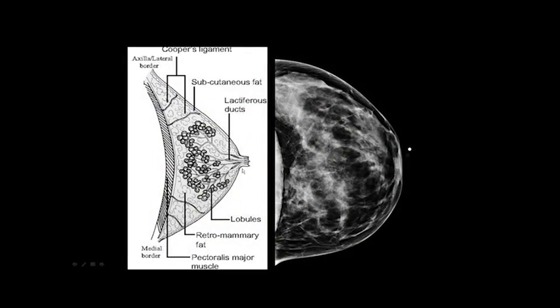So with the anatomy in the breast, we want to depict as much as possible on the image. Remember, you have to see the whole entire image. That's the law, but it doesn't say in one view. You want to depict your lobules, your ducts. You want them well separated, even though we can't see that physically in the image. We know it's there. It's part of the breast anatomy. Our vessels, our Cooper's ligaments, retroglandular fat. We see the muscle. You want to try and get the end of the parenchymal pattern in there, and you want your nipples centered.